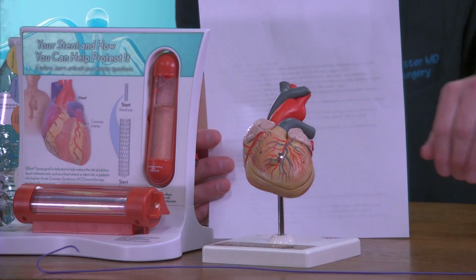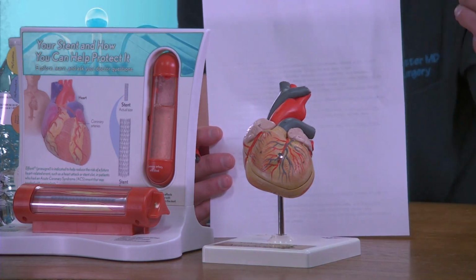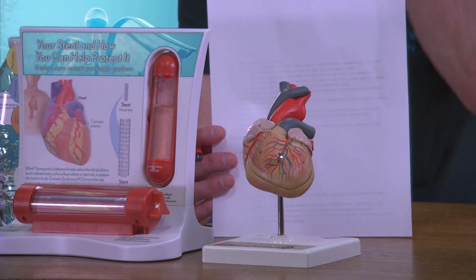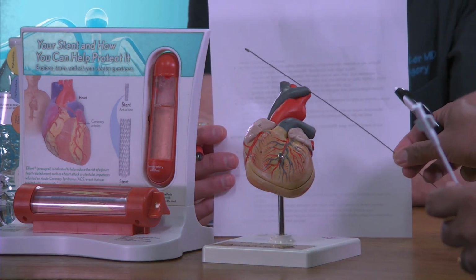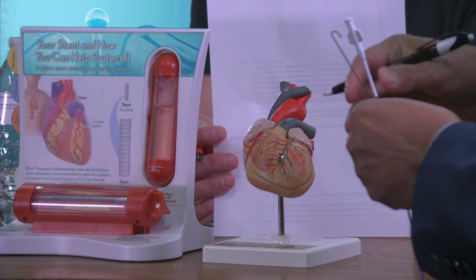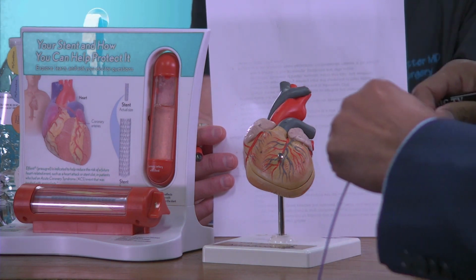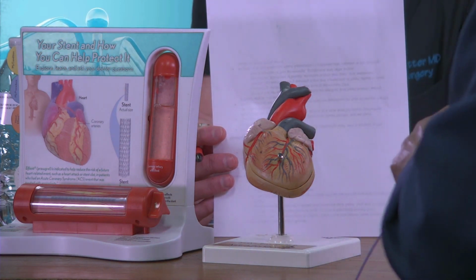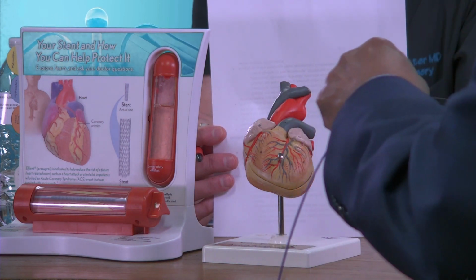And so this is the actual wire that we use. This is a run-through wire. Show us next to the heart because you're off camera right now. Okay, so that's an actual wire. That will be placed into the beginning of the artery as it supplies blood flow to the heart. That's right. And you'll be able to follow the whole thing because the dye is in there. It's going to show us which way to go.